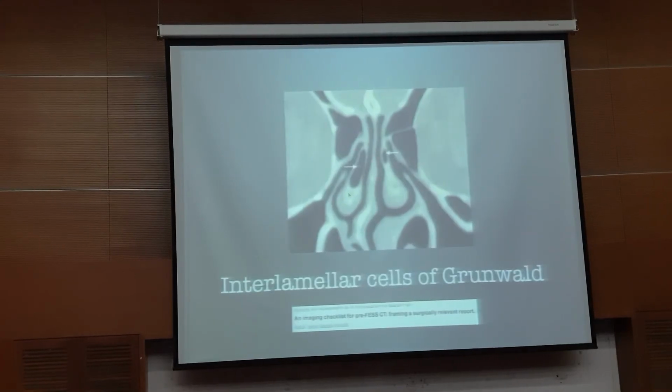So here is apparently another kind of pneumatization. If the pneumatization affects more of the middle or upper part of the turbinate, it is known as the interlamellar cell of Grunwald. Okay, but up to you to decide whether that's important.